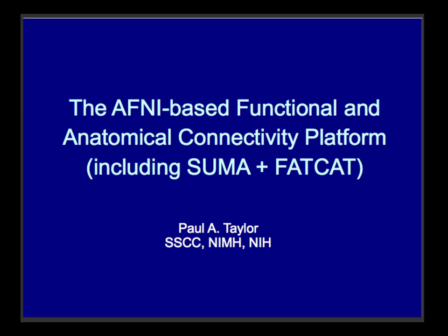Bob talked a lot about fMRI, which is kind of gray matter centric and functional processing centric, and I'm going to talk more about structural white matter structures throughout the brain. And really, if you do have any questions, or if I don't explain something, please do just ask a question while something is showing on the slide screen.